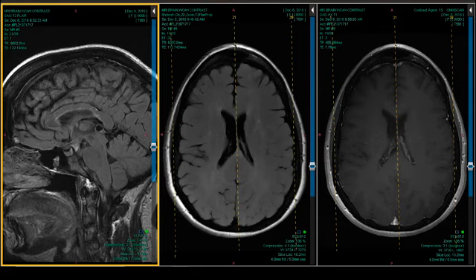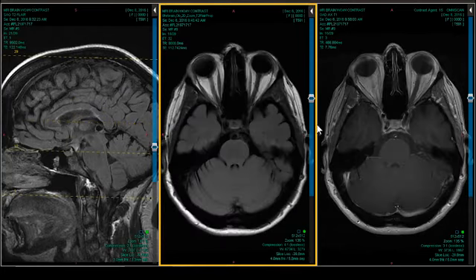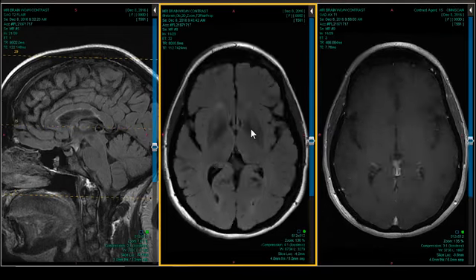So I think the first thought you should have is multiple sclerosis based on the imaging alone. And visual symptoms, that goes with multiple sclerosis quite well. Nothing is enhancing. And in terms of a neurodegenerative atrophic pattern, not so much. We see some nice brain iron in the globus pallidus.